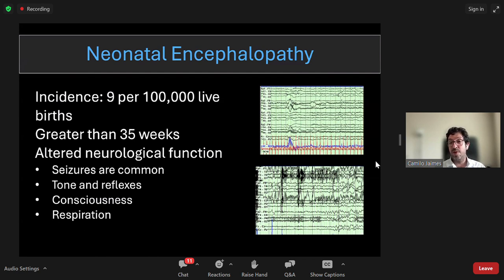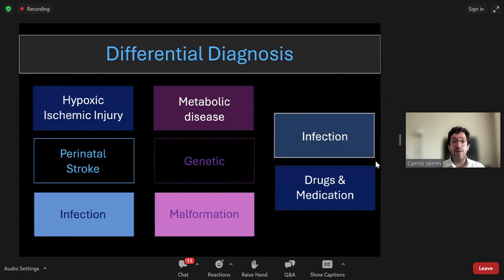But I wanted to emphasize and not diminish the fact that EEG, for example, provides you tremendous information. It may not be available in those first hours of life, but you can see it up top. This is a baby that had mild encephalopathy, but still has a normal EEG, which is what you'd expect for someone in the mild category. The one in the bottom is someone who has moderate encephalopathy and has an abnormal background with areas of burst and then areas of suppression. So this is a very concerning EEG. And I'm going to try to invite you through the talk to try to bring the pieces together, because we are looking at the MRI, but certainly a lot more is going on in those patients.